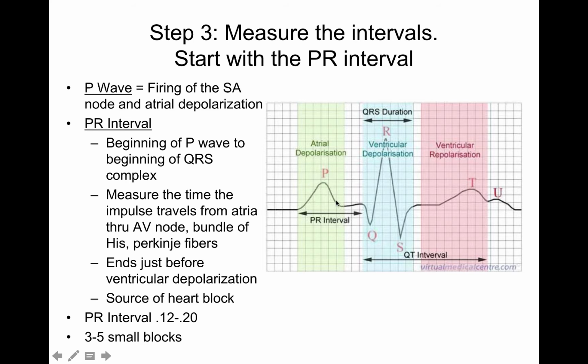What the P wave is indicative of is the firing of the sinoatrial node. It's saying that there is a signal pathway going through the atria. If you take this P wave right here and draw an A, that is originating from the atria. Now the next thing we have is the QRS complex, the depolarization of that. If you look at this, this is an upside down V. So this is your ventricular depolarization: upside down V, ventricular depolarization.